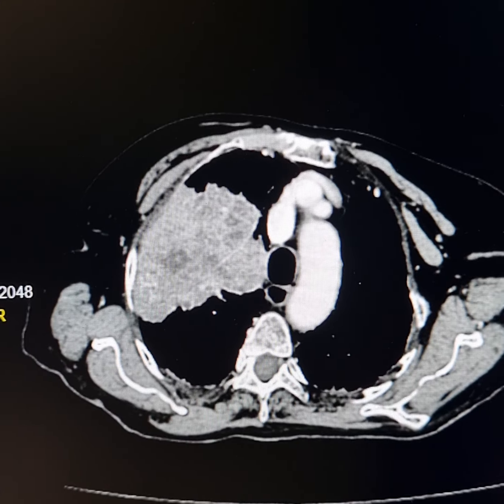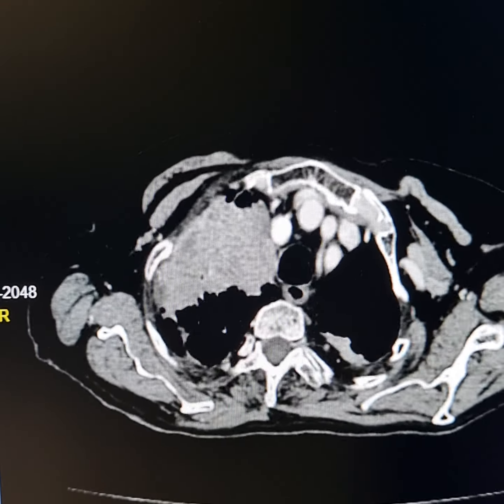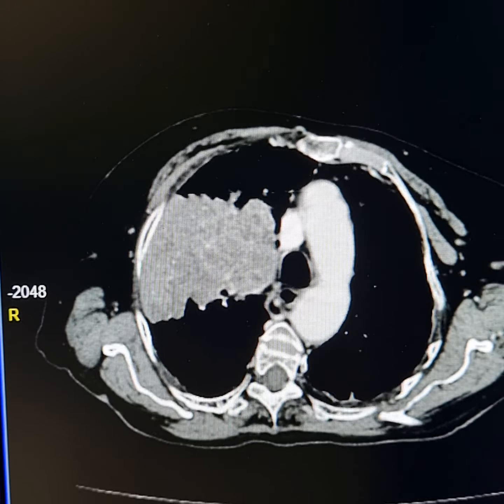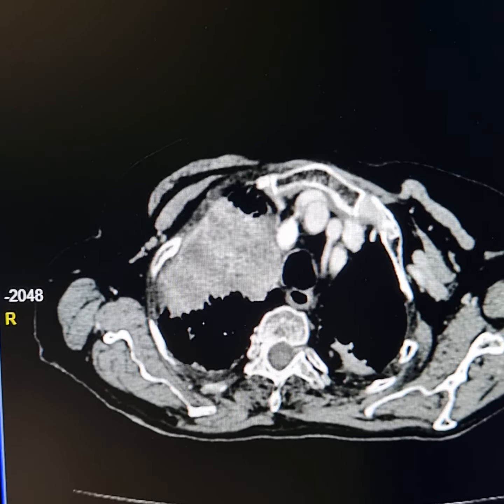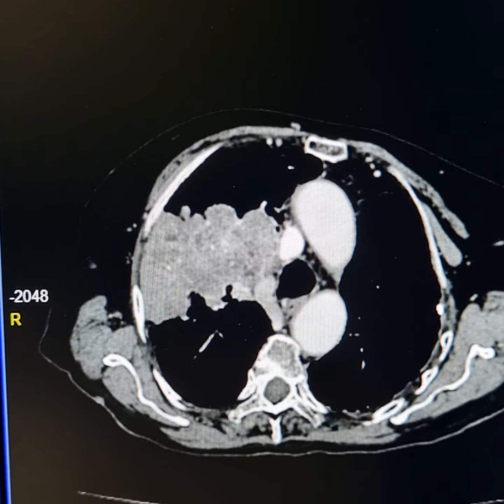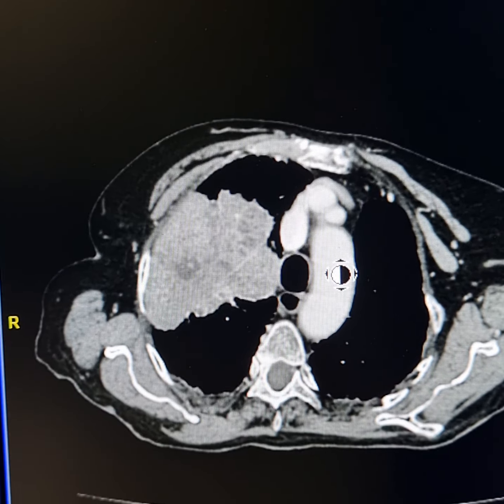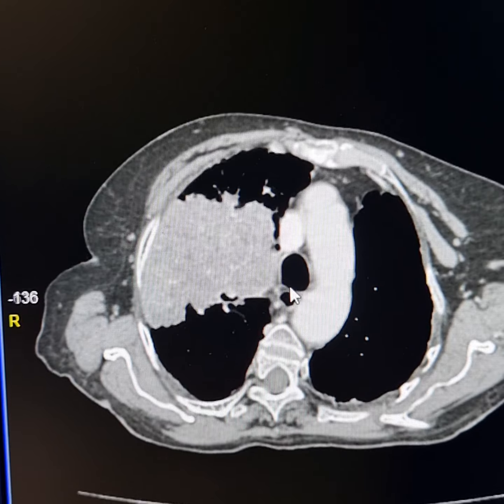Now this is the mass lesion here. This has involved the apical and anterior and posterior segments of the right upper lobe. This has irregular outlines and shows non-homogeneous enhancement. Anterolaterally, it lies in contact with the respective chest wall. There is no infiltration of the chest wall. Medially, the mass has infiltrated the mediastinum and it comes to lie along the right lateral surface of the trachea.